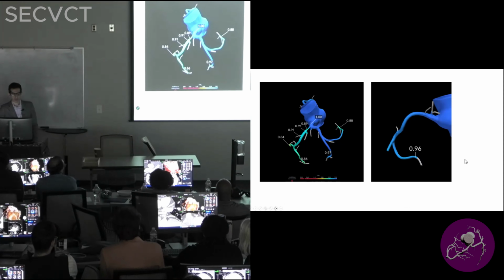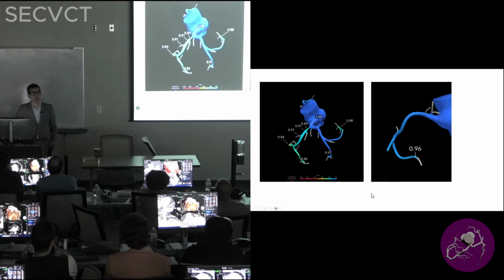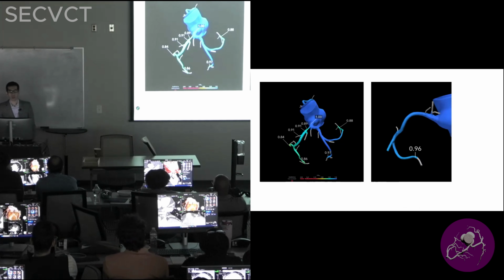So I need some volunteer to tell me this is the LAD. How would you interpret this result? Negative study. Okay, anyone else would like to challenge that? So Dr. Lima brought really a good point, validate the data.